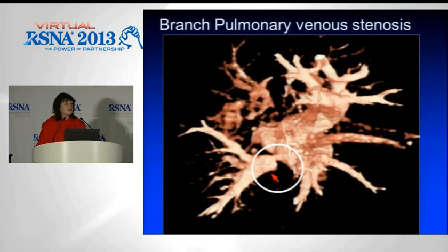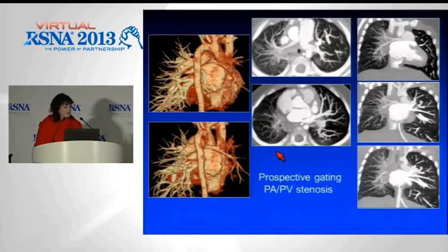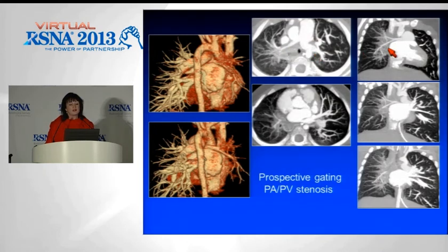Pulmonary vein stenosis, we really underestimate pulmonary vein stenosis. In premature babies, we are seeing quite a lot of patients with pulmonary venous stenosis. And you can see here upstream dilatation of the vein, very narrow area just adjacent to the insertion into the left atrium. This is another patient who, very interesting, had an echocardiogram for systolic function. It was a patient who was on chemotherapy for cancer. And you can see the right pulmonary artery very, very narrow, and you can see no pulmonary veins going into the back of the left atrium.